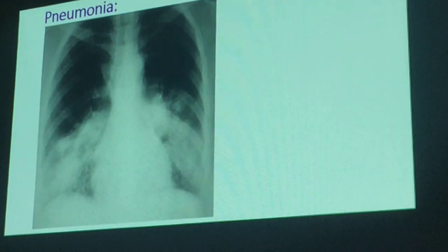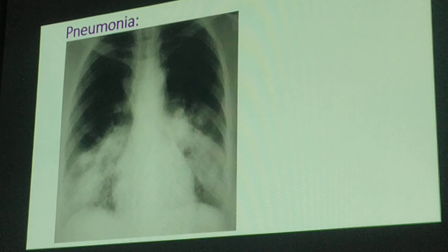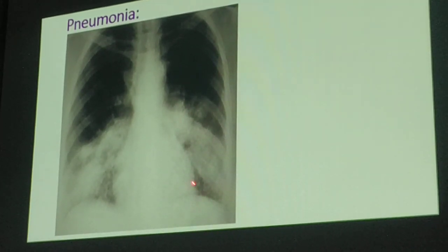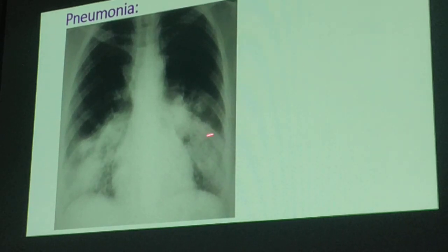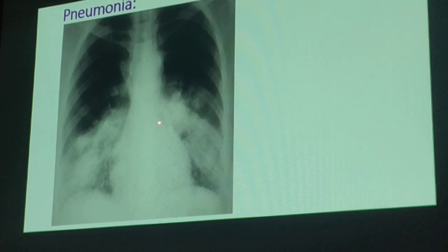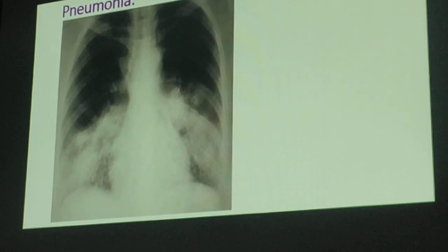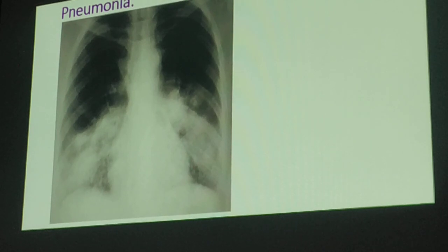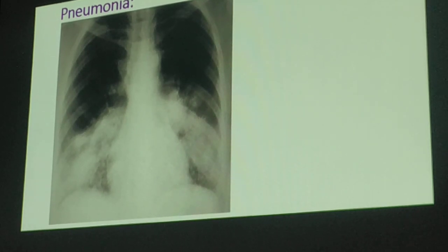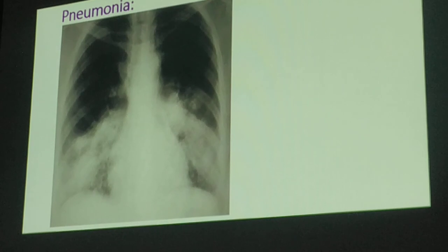There you are, and try to compare the bases of your right and left lung. They're almost the same, right? So there is consolidation of both bases. Maputi siya. So in here, radiologists would describe this as confluent haziness on both bases. Okay? When you say confluent, very minimal na lang yung aeration niya. You could hardly see visible air on the bases of both lungs. Okay?